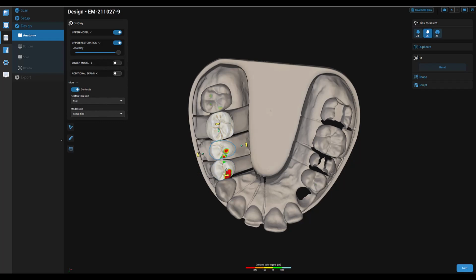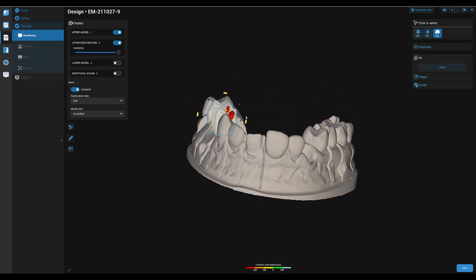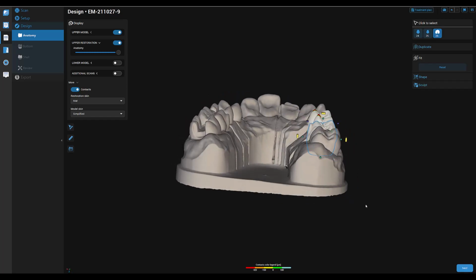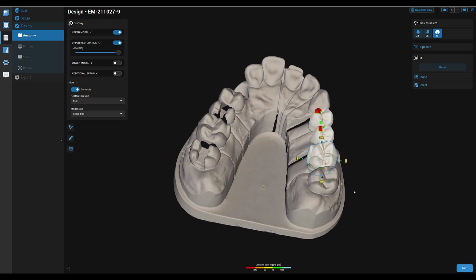With the different colored handles, you can change your design. To change the design to one orientation, you can use the blue handles. With the yellow handles, you can turn the element. To change your object to two directions, please keep the control button on the keyboard pushed while moving the handle. Always ensure that you check the design from different views.